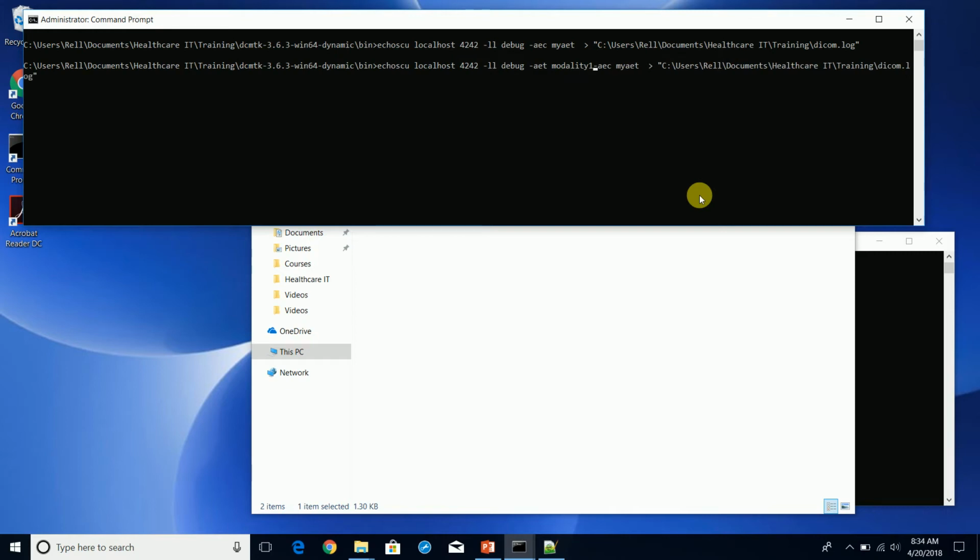We're going to set the calling AE title, and let's just go back to what it's supposed to be.